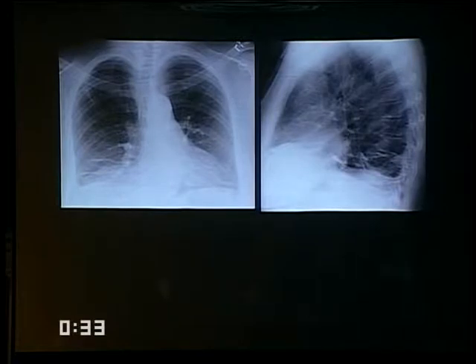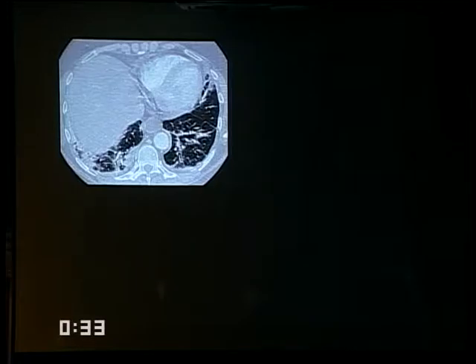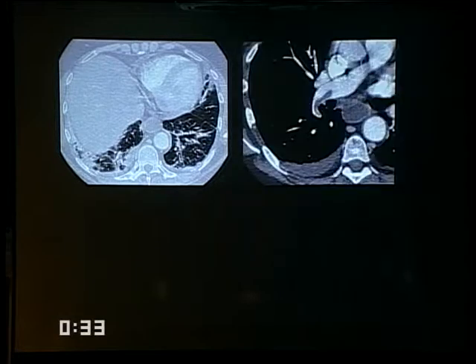And just based on this, we actually suggested doing a CT scan. And as we start up from the lung bases, as we do with our protocol, we run into a lot of just streaky areas of subsegmental atelectasis, as we saw on the chest radiograph. But as we get up to the hilum on the soft tissue windows, you see a very clearly defined embolus in the right descending pulmonary artery. Incidentally, there is a dilated fluid-filled esophagus, which would make one concerned also about the possibility of aspiration.